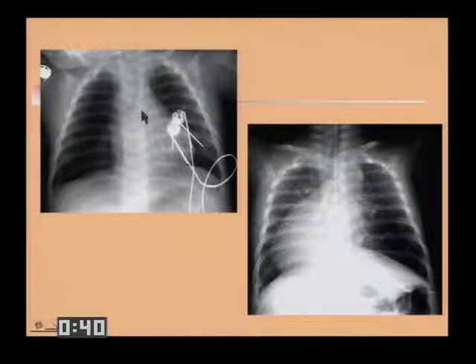This is a child who has either mirror image branching, which would bring him into the cyanotic heart disease, or non-mirror image branching, which would bring him into a more normal group of children with the right aortic arch. And those are little buzzwords to keep in mind.